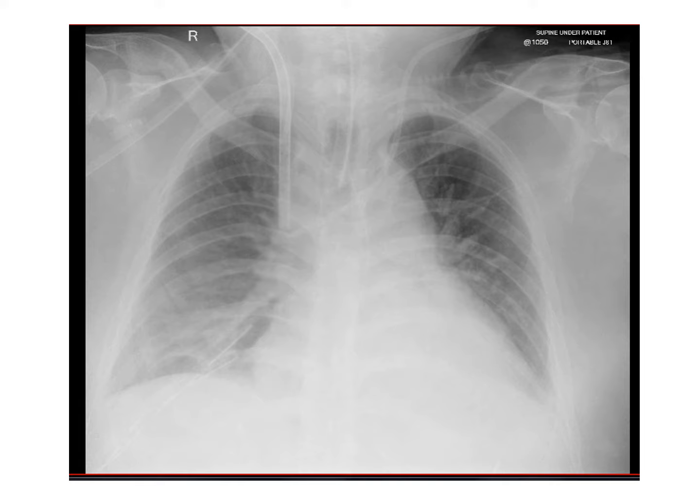This is a post-op liver transplant patient. You can note that the chest x-ray is actually a supine chest. They have an ET tube present. They have two right pleural drains and a bilateral internal jugular catheter. The left hemidiaphragm is not adequately visualized, and there is maybe partial atelectasis or consolidation in the left lower lobe.